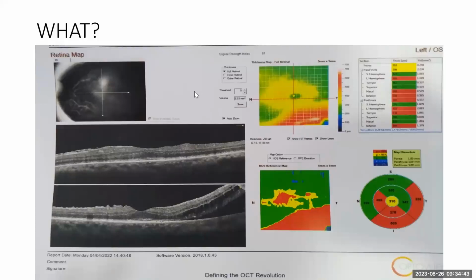Does any other person want to make a contribution? Actually, on this, there's no right or wrong answer. That's why I just say, tell me the abnormality you see. That's it. What is abnormal? And maybe let's focus on this map that I'm pointing out now, the lower one. What's abnormal?